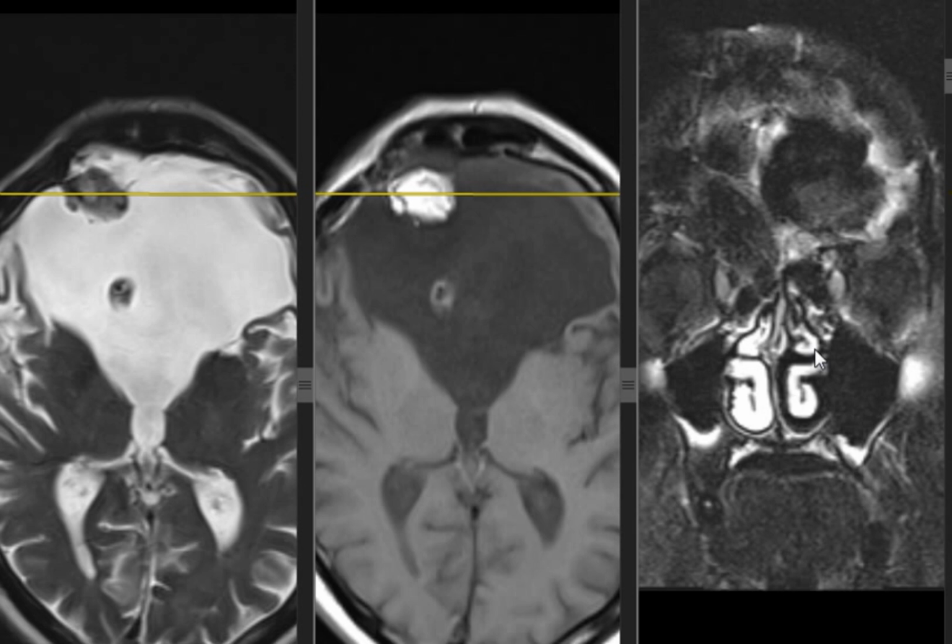Lipoma? This is fat packing. They do it in the surgery to close the defect. We put the fat pack in the defect when we remove the meningioma to close it. So this will stay there forever. It's just normal fat. The surgeon used it to close the defect. They call it fat packing. Sometimes they use fat, sometimes muscle, sometimes both fat and muscle. Okay? A post-surgical case, which is very normal, and thank you very much.